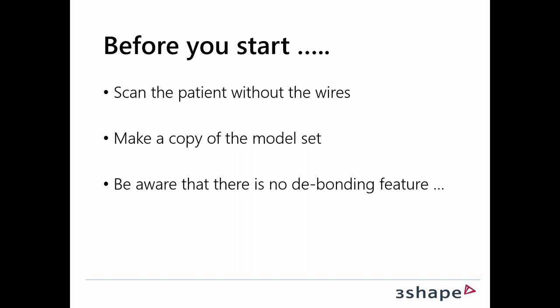And thirdly, be aware there's actually no debonding feature in the Ortho system, and you may think this is strange, having a video about a feature that doesn't exist, but actually we're using an existing feature in the Ortho system for doing debonding, and Rikke will show you just in a minute how that works.